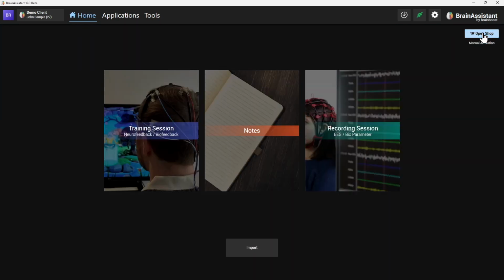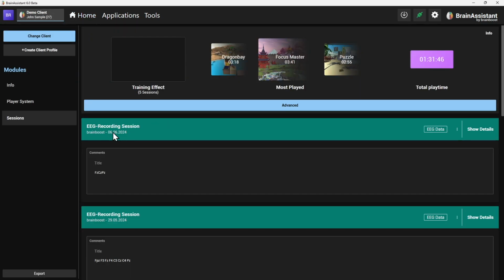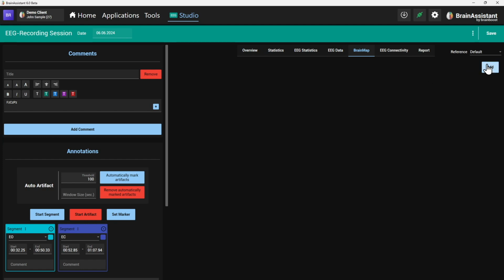All you now need to do, or can do after this webinar, is go to the client we just recorded. Here we will see our recording. This was today, the 6th of June. Here, this was my comment. Go and show details. I know some people are used to EEG data. Check out the EEG signal. We can create brain maps manually, right?